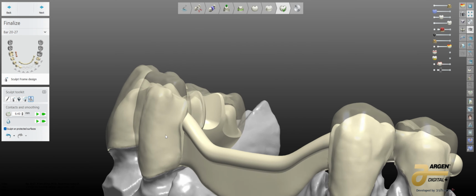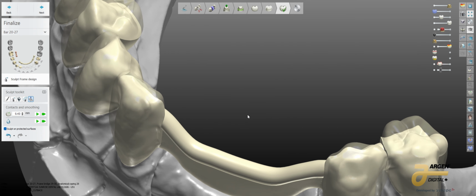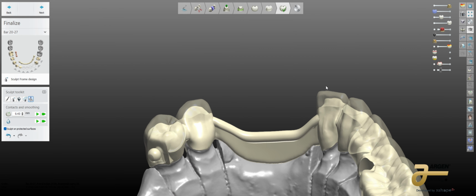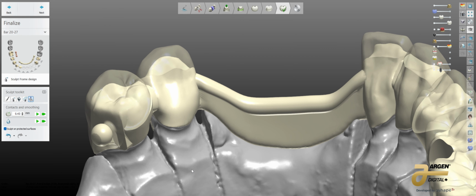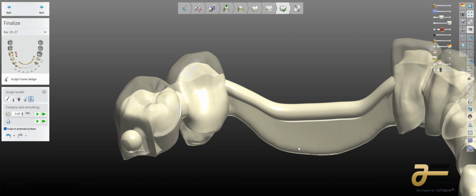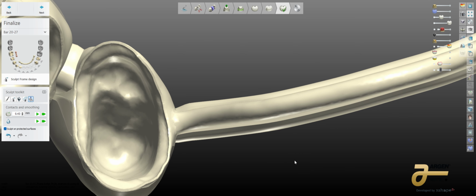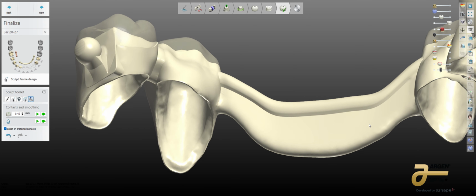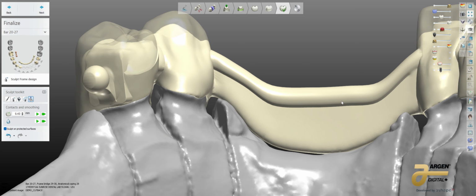We're going to thin out these areas post-mill as well. We can get it down very, very thin without having fear of popping. But let's talk about some of the tools and what we've done here. Well, inside this aspect of it's going to take one part of the bridge and it's going to allow us to sculpt all this. And if you remember how sharp that bottom edge is, well, all I'm doing very quickly in this is I'm just radiusing that small little part where it comes through the model.